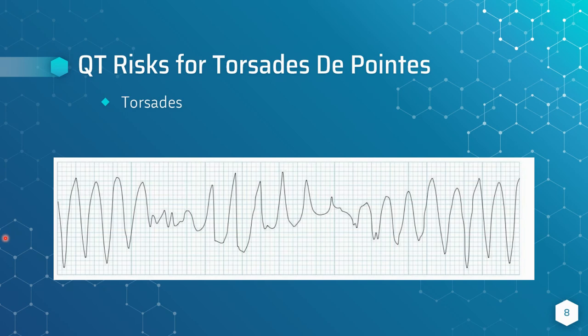With torsades, the biggest thing is obviously electrolyte imbalances, so hypomagnesemia and hypokalemia. But if it's the MI form and you shock this patient out of this rhythm and they have a shorter QT, then you can give the amiodarone, your lidocaine, your procainamide.